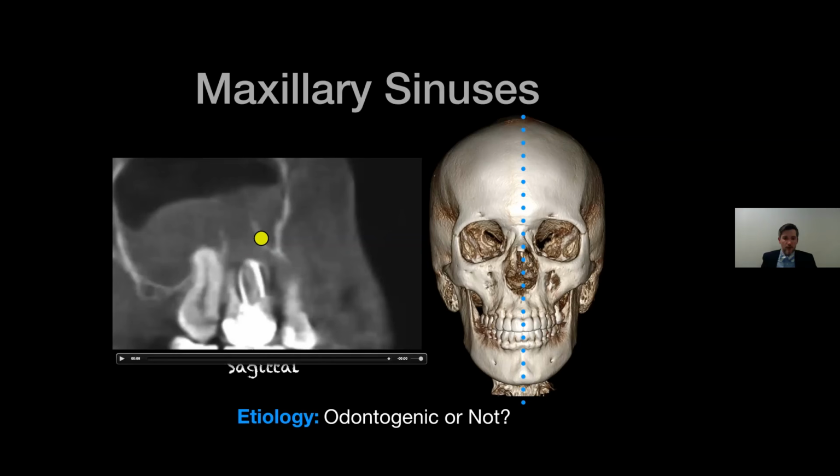So here's the periapical lesion, and all of this is inflammation in the sinus because of this tooth infection. If I were to write this in a report, I would call this odontogenic sinusitis: sinus inflammation due to a tooth infection, and in this case, non-healed endo.